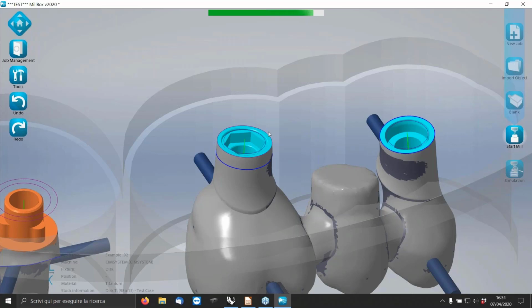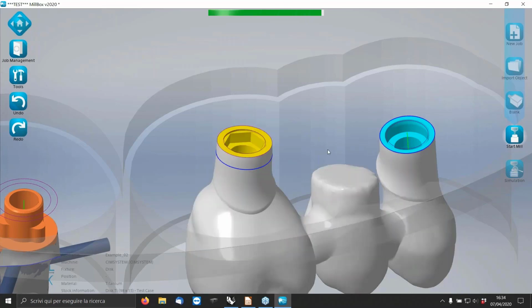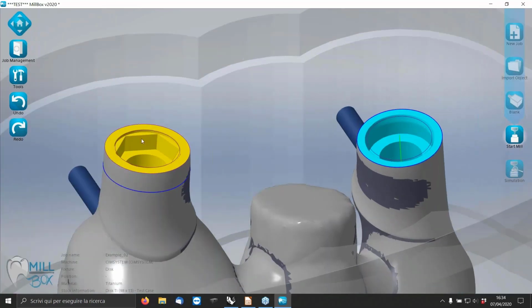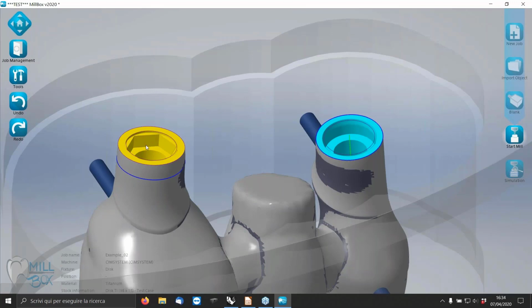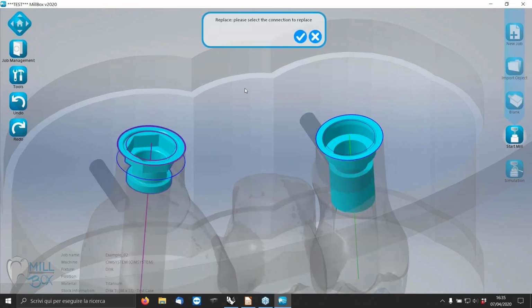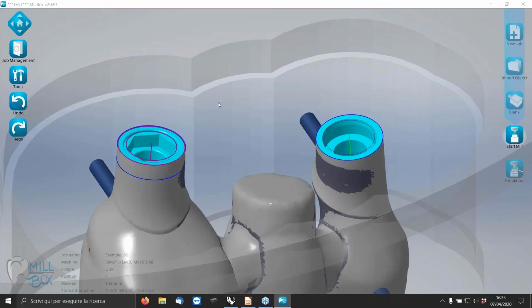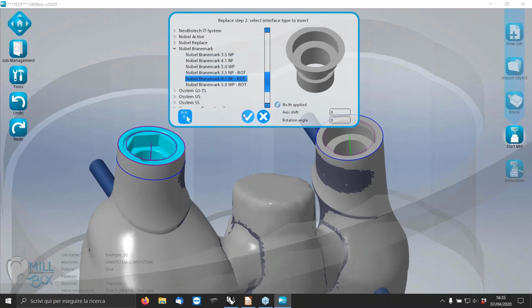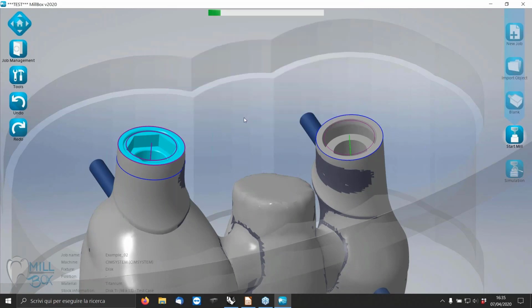And as we see, automatically detect and draw some curves, axes, etc. Here I replace the same. Just an error. I have to replace with a rotational one. This is an anti-rotational one, and I want to put the rotational. Okay, that's it.